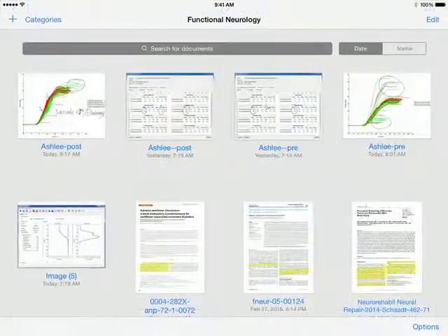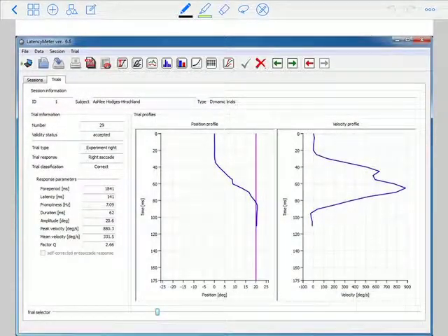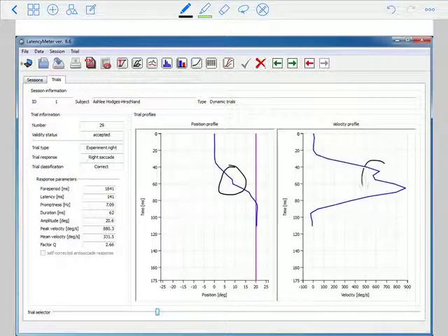Okay, so let's take a look at the individual trial I was going to show you as a sample. It becomes much more clear. I always recommend that you look at the individual trials. Reason one is that I find that the saccadimeters are rejecting perfectly legitimate saccades, so I like to go in and make sure I check them off to be included in the sample. But you can see here in this young female patient's case, there's the hitch between 5 and 10, just short of 10 degrees, and there comes the intrusion.